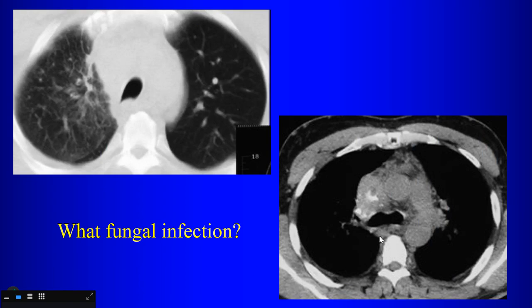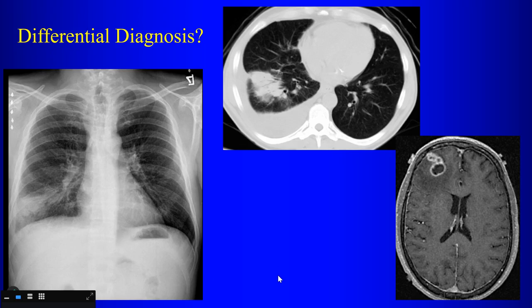Because of the calcification, what process are we going to be concerned about here? Fibrosing mediastinitis if it's histoplasmosis infection. Okay? Here you've got brain lesions, brain abscesses, if we're talking about infection, and you have something in the lung, so nocardiosis, right?